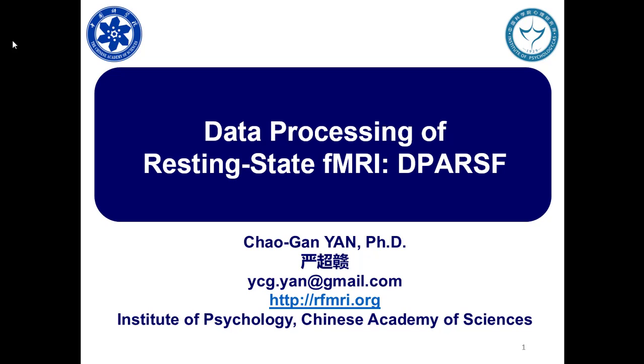In this part, we are going to introduce DPARSFA. Mainly, this course covers both DPARSFA and DPABI itself, and all of it is integrated in DPABI. But we would like to introduce DPARSFA first, because all the operations in DPABI are pretty similar to DPARSFA. If you can use DPARSFA, then you can go very smoothly to using DPABI itself.